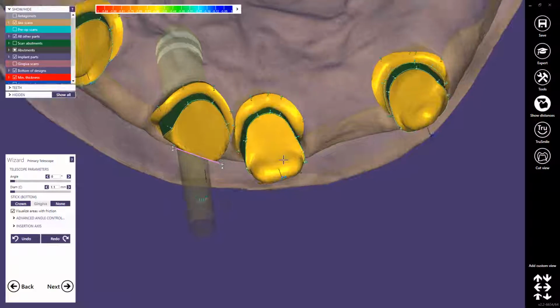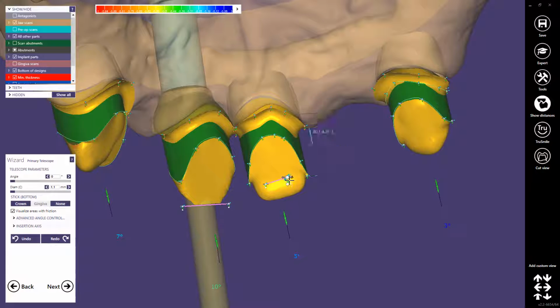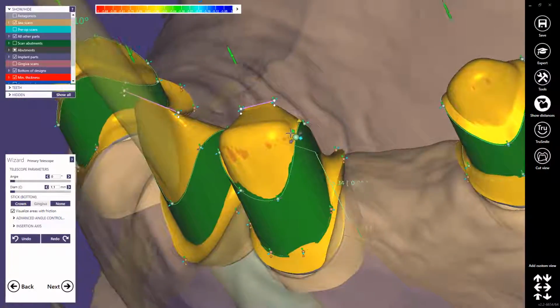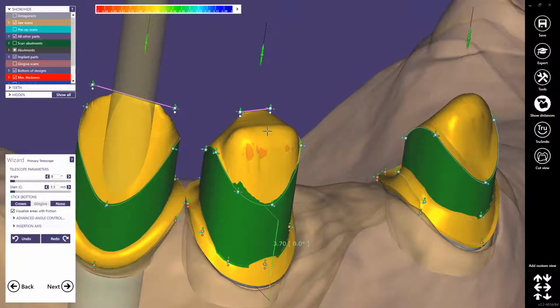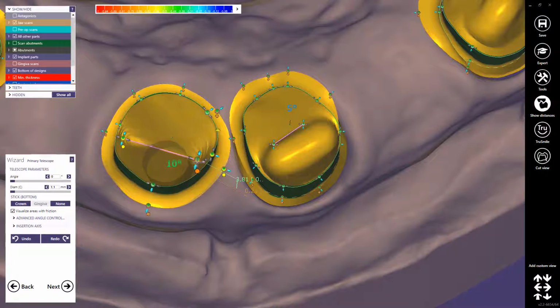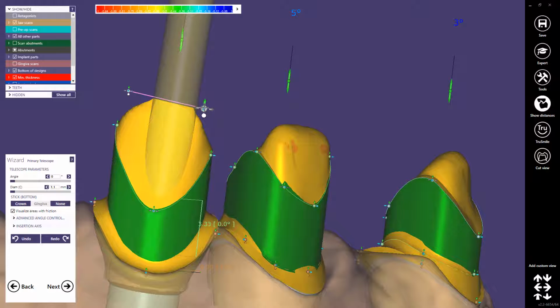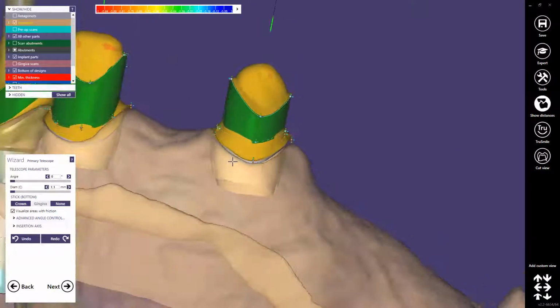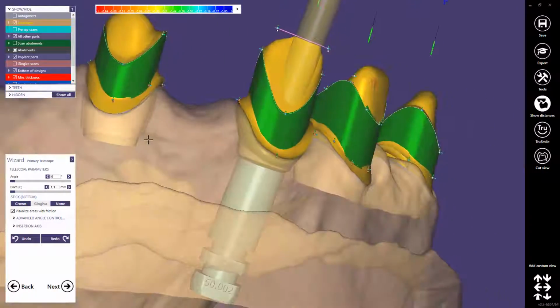You could even, if you want, add such a control line on the other ones, and if you want to quickly add some material in some occlusal areas, but I usually try to do it as thin as possible. Therefore, let's use the panic button, the undo button. Okay. Let's check again here just the buccal borders. This is the most important, that they are as thin as possible.